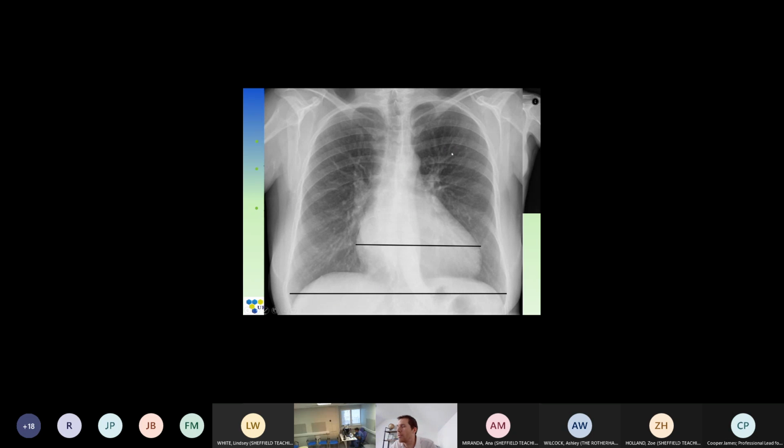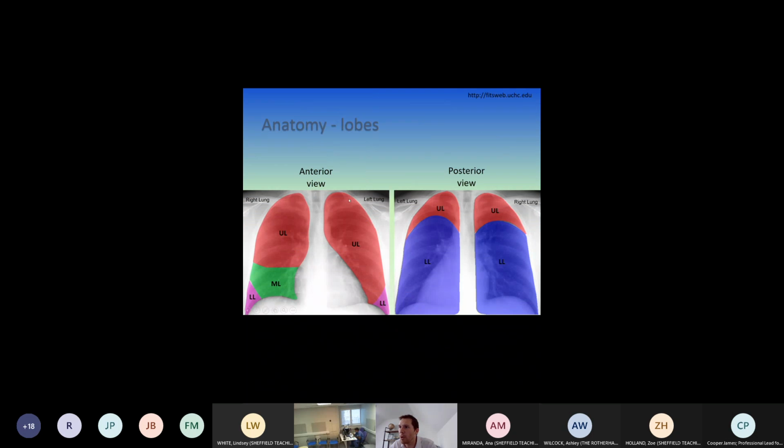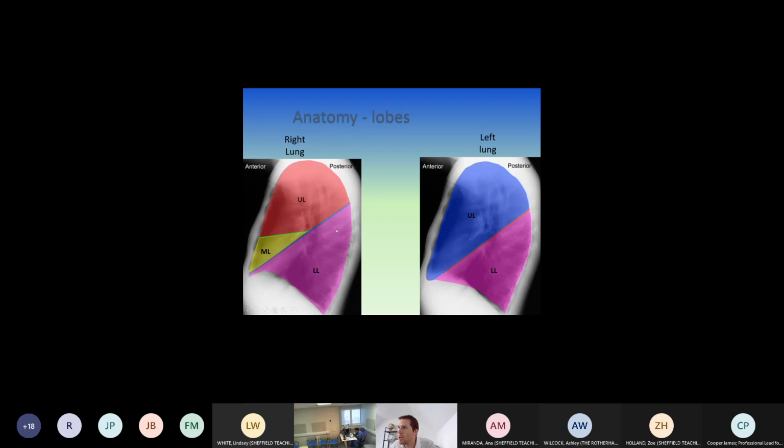Likewise, on this side, I can have a nodule there, and it could be in lower lobe. Equally, I could have a lung nodule or a mass down here, and it could be in upper lobe, and that's because the upper lobes come quite far down, almost to the hemidiaphragms, and the lower lobes go almost to the top of the chest. You can see that a little bit more clearly on the lateral views. We can see the lower lobe comes up more than 2/3 of the way of the chest, and the upper lobe comes right down to where we see the hump of the hemidiaphragm.